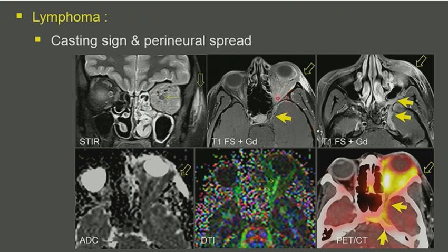And after injection of contrast material, we see extension intracranially into the cavernous sinus, extension along V2, into Meckel's cave, extension into the pterygopalatine fossa, and into the soft tissues of the cheek. Now, if you look carefully here at these soft tissues, this was where the original biopsy was obtained.